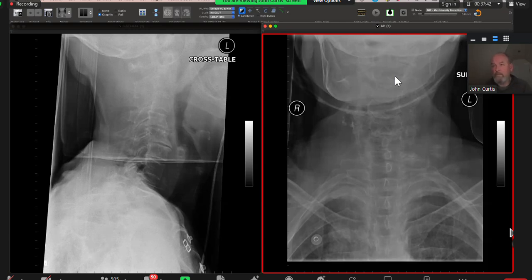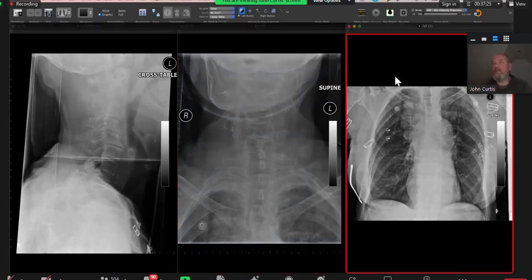I cannot see any specific finding within both lungs, but I think here in this area I can see a soft tissue mass lesion. What would you do next? A full dedicated chest radiograph, then a chest CT scan with IV contrast. Okay, what's the diagnosis? I can see vessels pass through this mass lesion, making it a mediastinal mass lesion, and as the mass does not extend above the clavicle, I think this is an anterior mediastinal mass lesion.